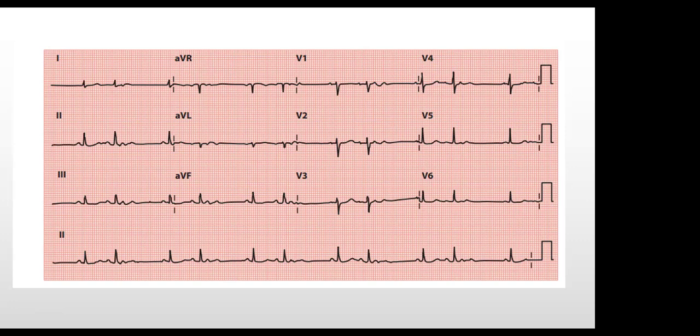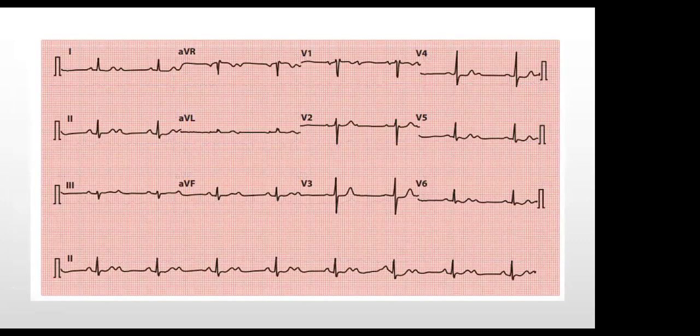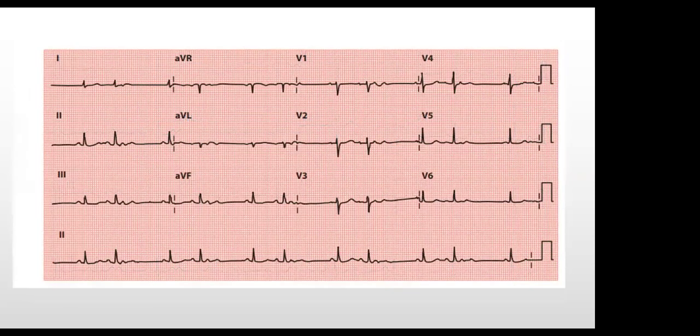All right, thank you. Please, if I may also add, the strength with Mobitz 1 is with the fact that the new beat's PR interval is always less than that of the one that ended the cycle.